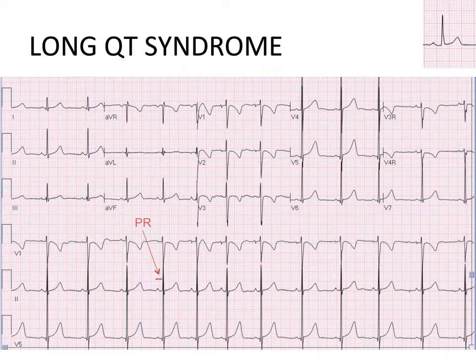You can see that the PR interval is 120 if you multiply 3 small boxes by 0.04 seconds each. Because of the sinus arrhythmia, the QTC is a little trickier to calculate. Typically, you should calculate 3 to 5 different QTC intervals and average them together.